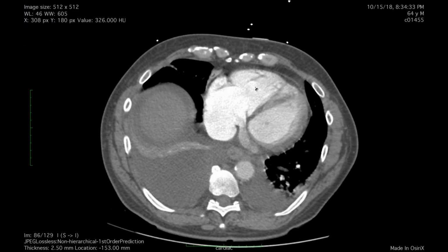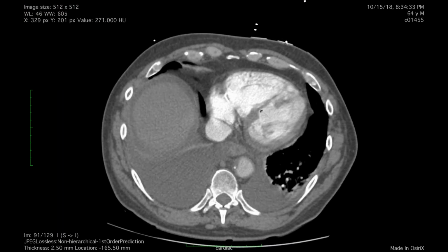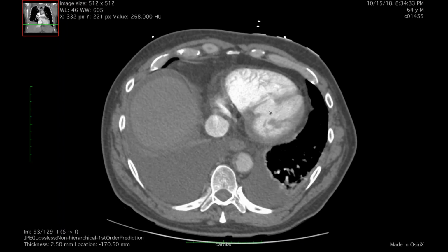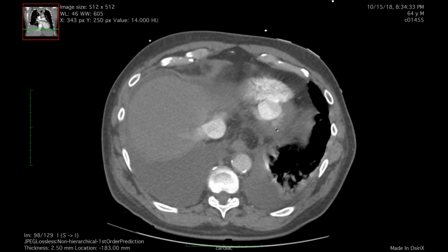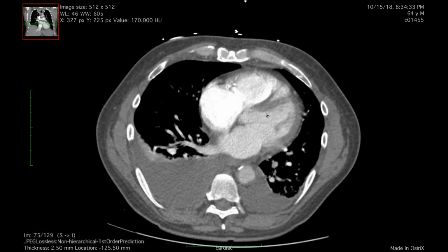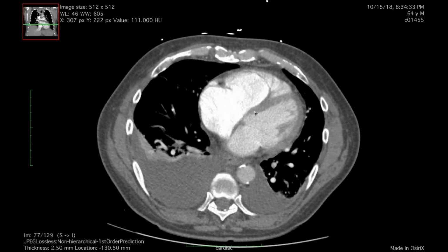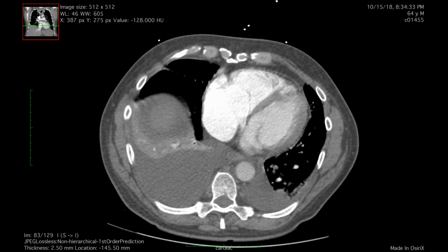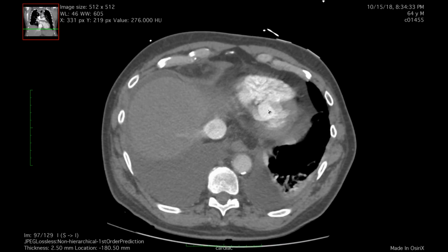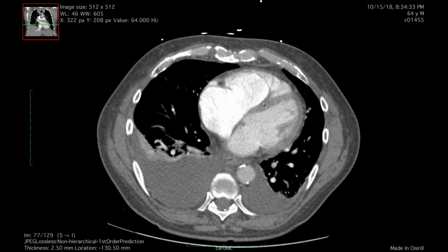You can notice that his right ventricle is a little dilated, and this was not noticed at the outside hospital. I'll direct your attention to the lower portion of the interventricular septum, where you can certainly see that there's an abnormality here. I always tell my residents, the question is never really PE. The question is, why are they short of breath? Why do they have chest pain? And this guy had an infarct, not surprisingly, 3 or 4 weeks before. And of course, you can see here that he now has an acquired ventricular septal defect, which accounts for why he's got all this overcirculation.